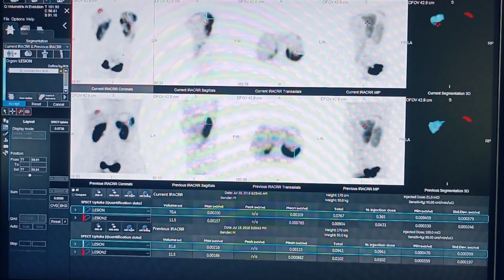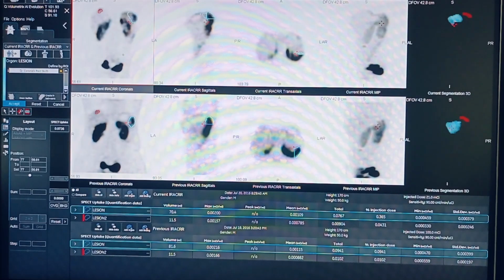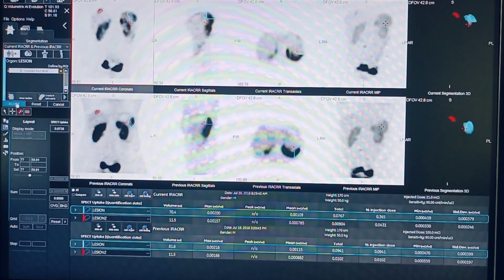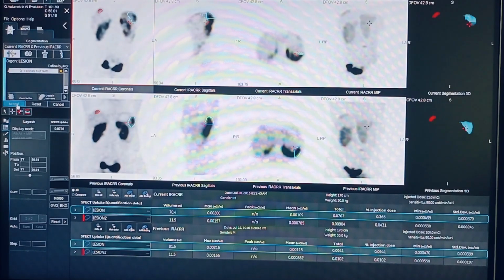One cut will separate in the 3D direction. But sometimes if the tumor is very large and you see that it has not cut the desired areas, then you can scroll and cut it again. These are the manual modifications. Then click accept.